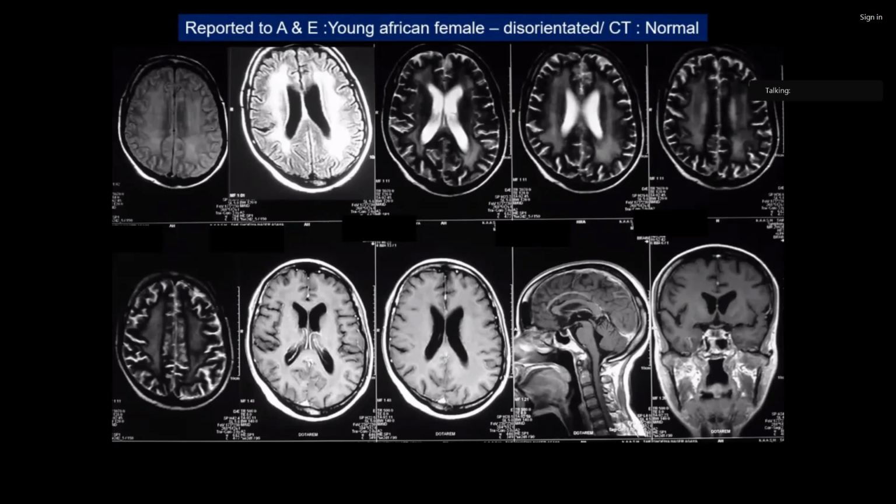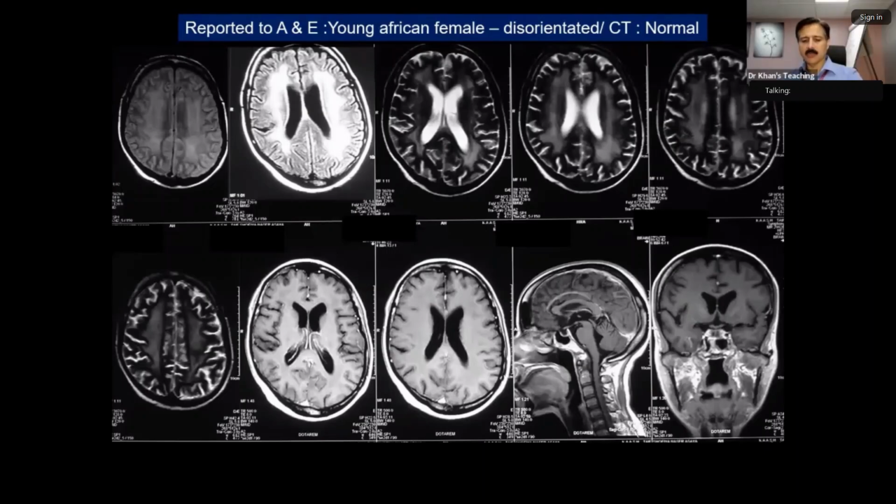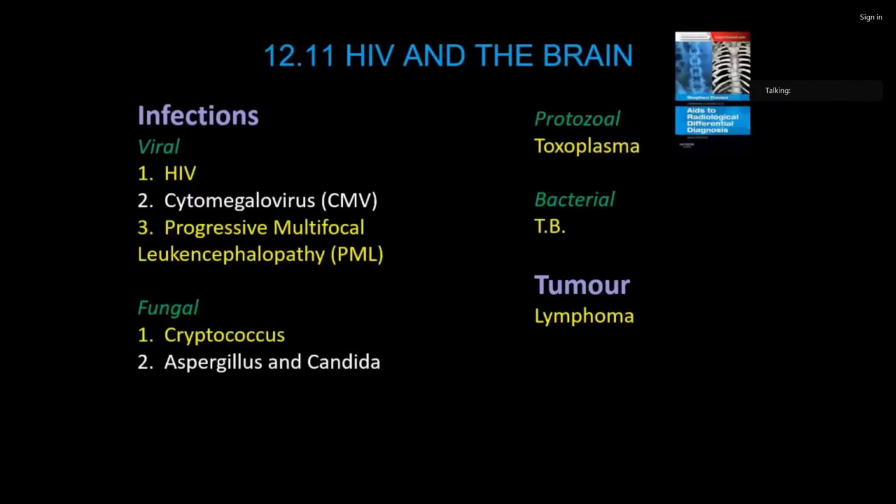It does not fit PRES, or also does not fit demyelination, or maybe a severe form of demyelination or severe form of vasculitis, but I'm more inclined towards white matter diseases like PML and HIV leukoencephalopathy. Excellent. Okay, well done. Now, candidate 3, thank you very much. Well done. And candidate 4, raise your hand, but I'll do a bit of teaching on this case.